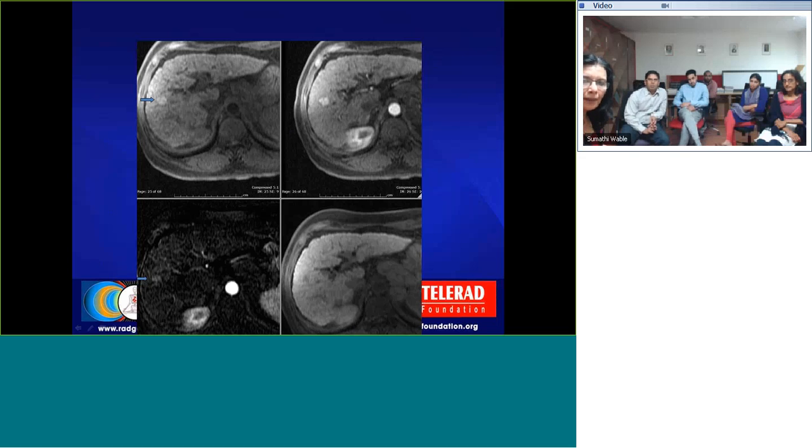Typically, if the patients are cooperative and they follow instructions, it works out. So there is some enhancement on the subtraction images. Typically, most of the centers automatically subtract everything. We used to selectively do subtractions because otherwise there would be 1,500 images. Anyway, subtraction is helpful whenever you have a hyperintense lesion on T1 before giving contrast.